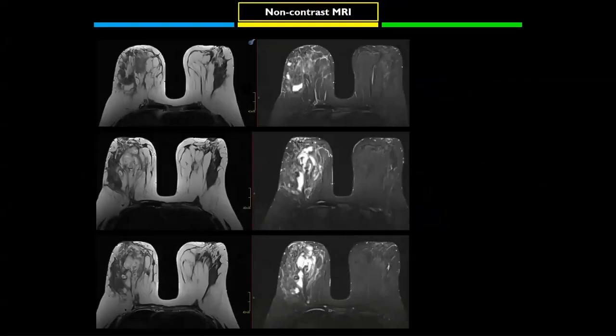I just need to see the T2 weighted image and the STIR of the same patient. And by this time, she actually had well-formed abscess cavities and ill-defined collections within her breast. And as we said, a bright signal on the T2 and the STIR with multiple abscess cavities confirms that this is an infectious and not a malignant mastitis.